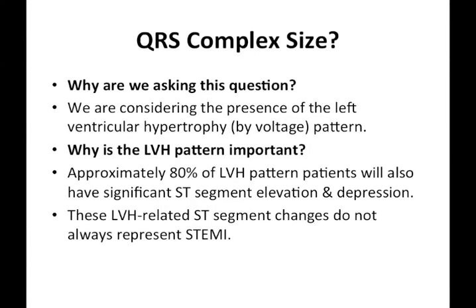So let's talk a little bit more about why we're asking this question. Why are we asking this question, you might ask? We are considering the presence of LVH, or left ventricular hypertrophy pattern. And why is the LVH pattern important? Approximately 80% of patients that have the LVH pattern will also demonstrate significant ST segment elevation and ST segment depression. These ST segment changes are not always related to STEMI and can confuse the unwary and unschooled ECG interpreter to diagnose infarction when it is not present.